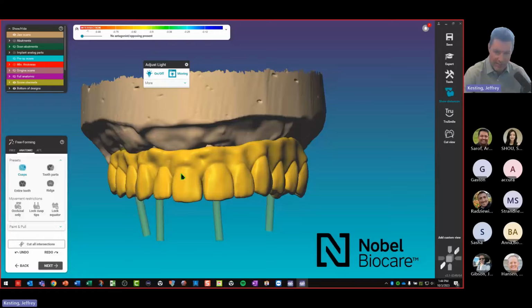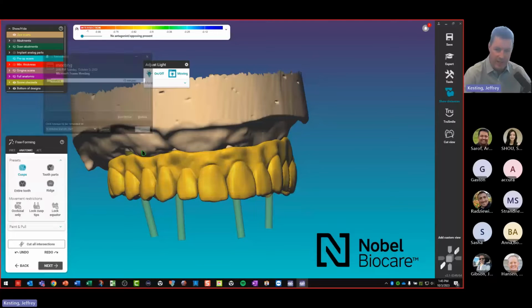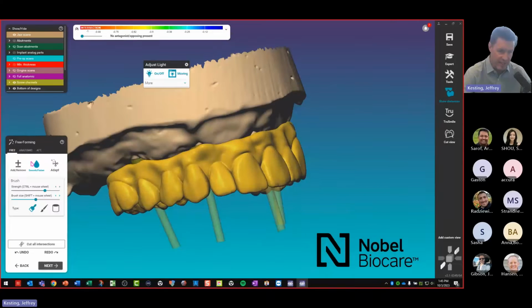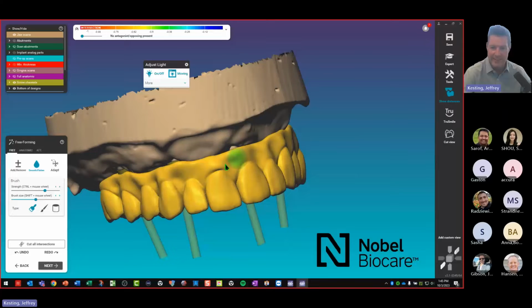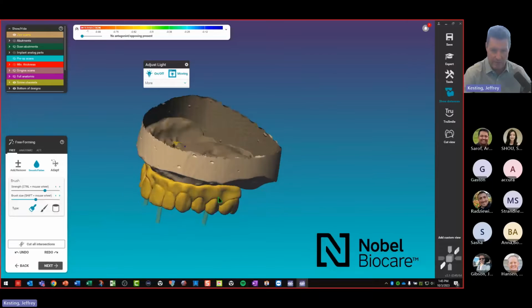Some tricks here where you can just actually pull it and get it back in if you needed to. But yeah, it's a lot of design. There's a lot of information online. exocad has some great groups for design. There's some amazing things that people are doing out there, probably a lot better than my ugly looking bridge here. But yeah, you can see what you can do. You have freeform design control here, which is really great.